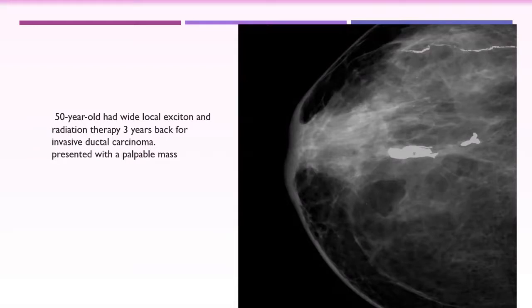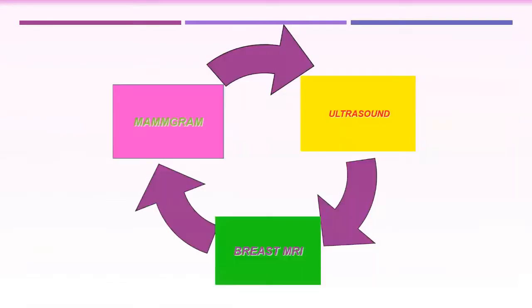What else? If it displaces, that means there is a mass effect. There is something pushing this calcification from its place, indicating there is something underlying growing. These are the main features we use to help us in evaluation for recurrence using this type of calcification.